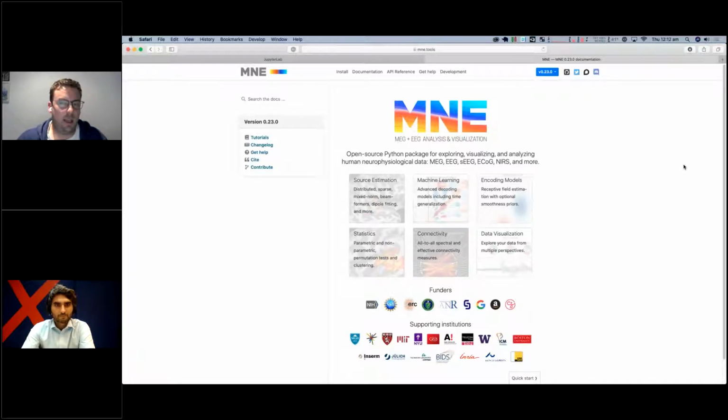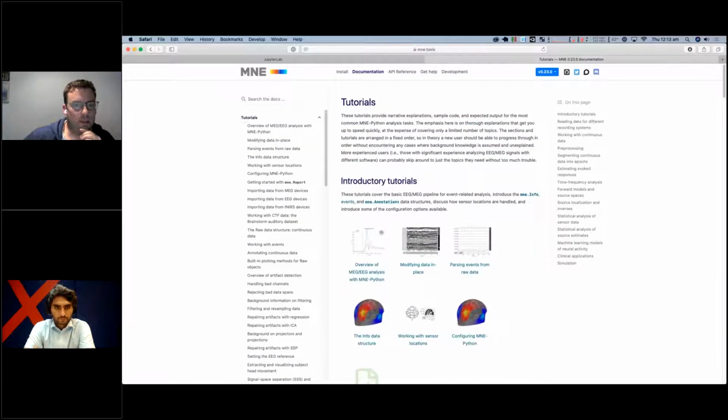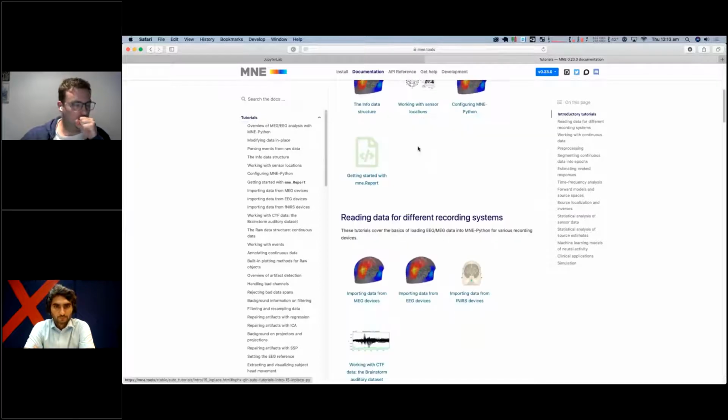Well, on the resources, the top response there. This is the MNE website. This is the front page, and you can see that it's a well-supported and well-funded project, and it has what I would say is second to none documentation. I'll just quickly walk everyone around. If you click on the documentation tab up the top, and then hit the tutorials button on the left, you can see there's a long list of tutorials here.